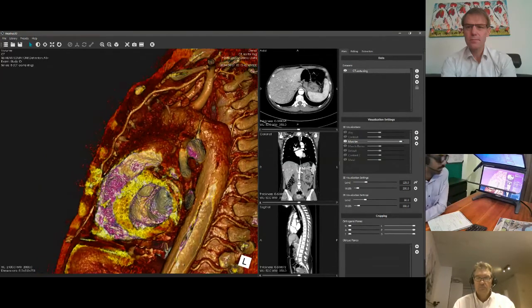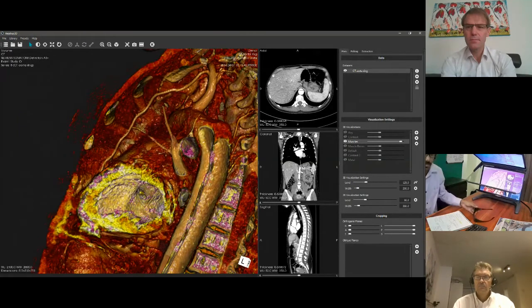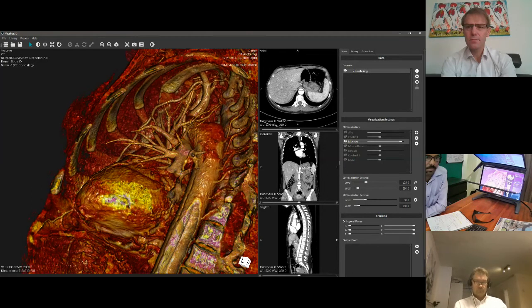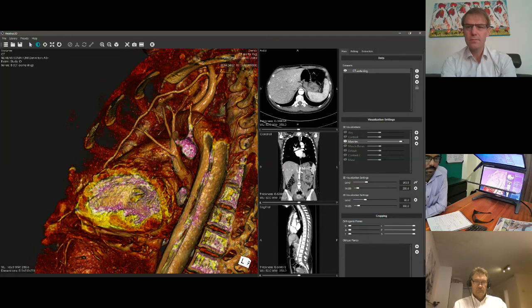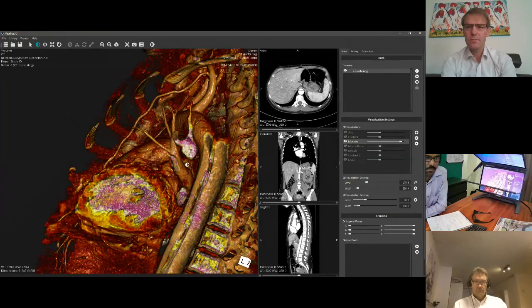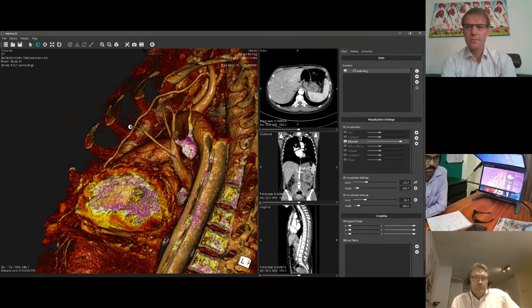And we can actually see where the rupture and where the problems have appeared. And anyone can see here that this is the original aorta, the real lumen, and the false lumen is over here, that most of the blood flow is going on the wrong side. Now, what you also can see then is where all the relevant connections are. Which vessels are coming now out of the false lumen and which vessels are coming out of the real lumen. So this makes it possible to really see that and really visualize that easily.